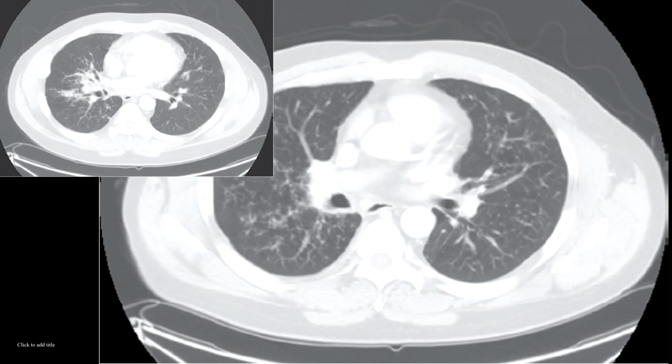Student doctor. What is the purpose of staging sarcoidosis on the radiograph? Does this staging apply to the CT findings? It helps predict outcome. Stage 1 disease is associated with 55 to 90% resolution, Stage 2 disease with 40 to 70%, Stage 3 with 10 to 20%, Stage 4 with 0%. The staging does not apply to the CT findings.